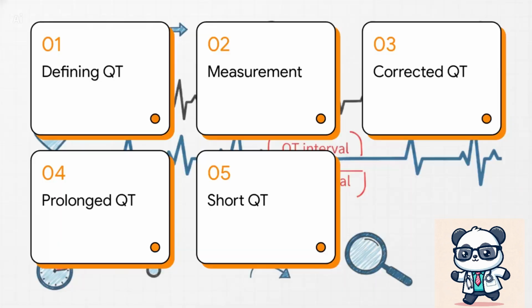Let's dive in. In this quick teaching module, we'll cover defining the QT interval, mastering the measurement, calculating the corrected QT, and then we'll look at both prolonged and short QT scenarios in the real world.